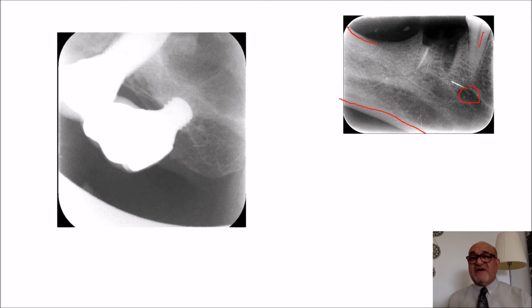This is the 5, and this is the tooth that has been extracted with a retained root over here. If this is the midline, I will extend the arrow. It will be directed towards the left, so this is the right side of the patient.